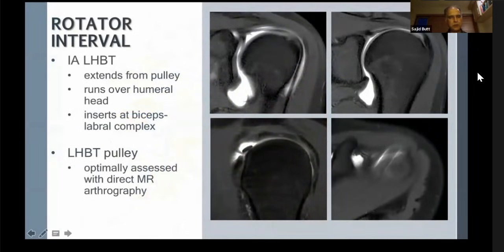If you look at a good quality MR arthrogram, you will be able to see these structures quite nicely. So here is your biceps tendon. See, it's swinging around over the bicipital groove here and attaching to the supraglenoid tubercle there. The superior glenohumeral ligament would be here, and then it will come around there and just attach on the medial lip of the bicipital groove. You can't see it that well here, but that's where it would be. I'll show you in a sagittal image, which shows it much better.